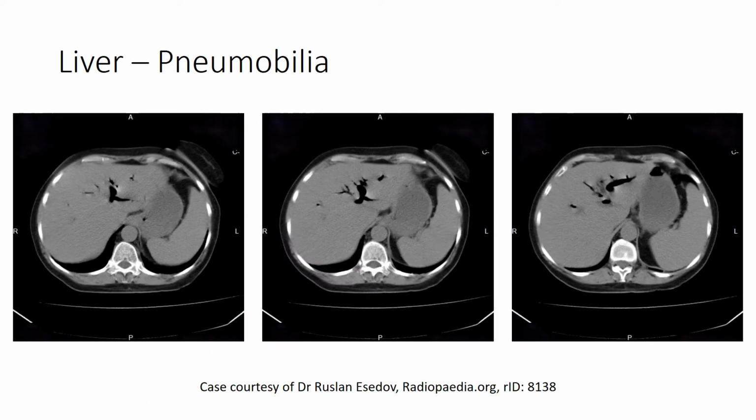Air within the biliary tree is also worth making note of, being a relatively common sign, usually as a result of biliary instrumentation, such as ERCP with or without sphincterotomy, cholangiography, or a Whipple's procedure or any other type of choledochoenterostomy. It can more rarely occur as a result of infection, such as cholangitis or emphysematous cholecystitis.